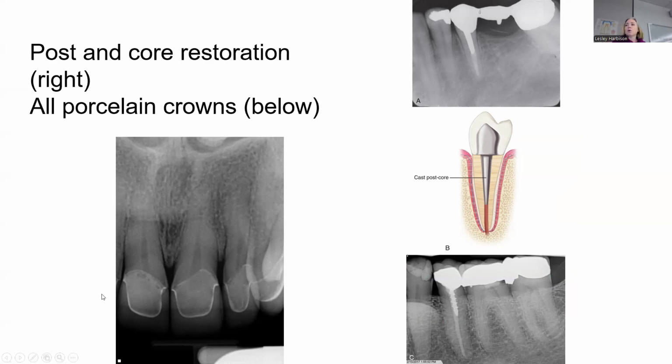So down here we have some porcelain crowns. You can see the really strong outline of the prep, and then they've lined it with some kind of radiopaque cement, and then the prepped tooth is around it. Here we have some PFMs, or porcelain fused to metal, and then we have a root canal. There's a couple different things with the root canal. We have a screw, and then we have gutta percha. Sometimes whenever you have a root canal, the tooth becomes more fragile. You've lost the blood source, you've lost the nerve. They've taken all that out, and the tooth is essentially dead in the mouth.